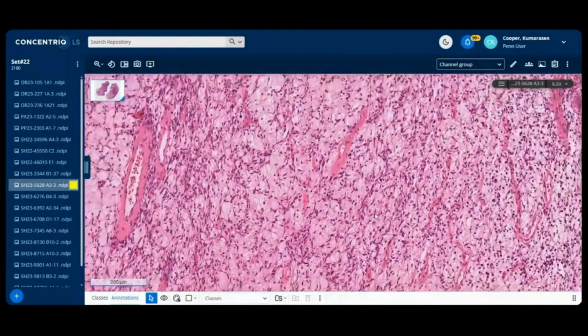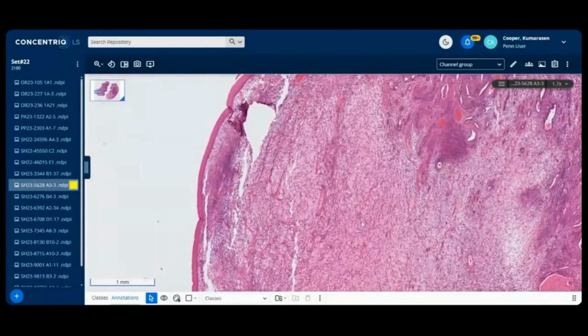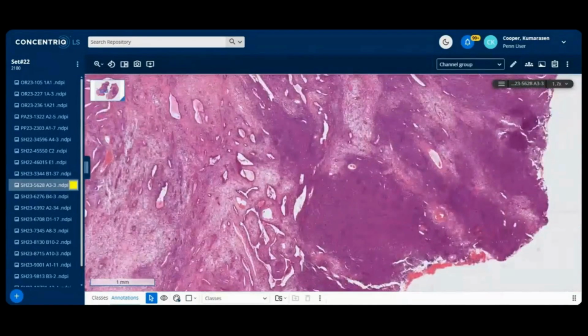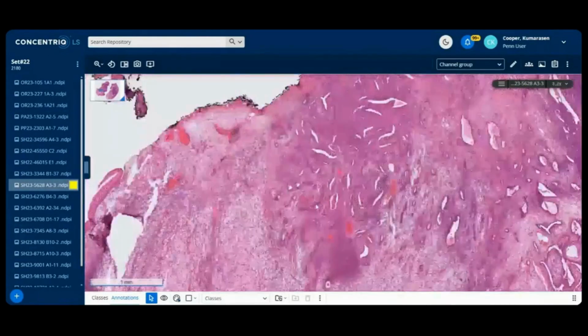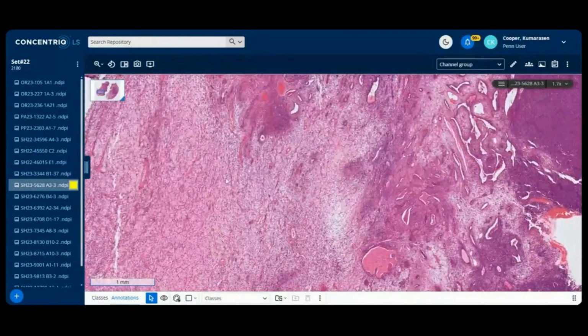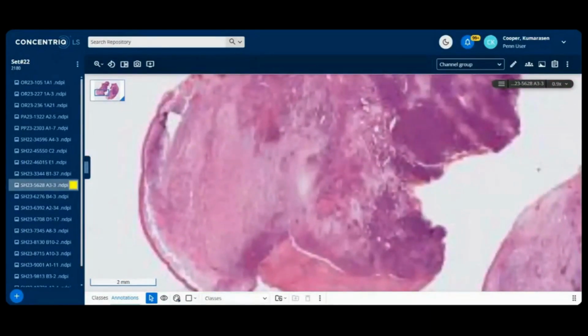It's often predictable that the needle core biopsy could just get into these areas, and you don't necessarily see the more diagnostic areas. The staghorn vasculature, which I alluded to earlier on, is a nice feature for synovial sarcoma as well. As you know, there are many other tumors that have that staghorn vasculature, including SFT, mesenchymal chondrosarcoma, endometrial stromal sarcoma, etc. Any comments? Anything?